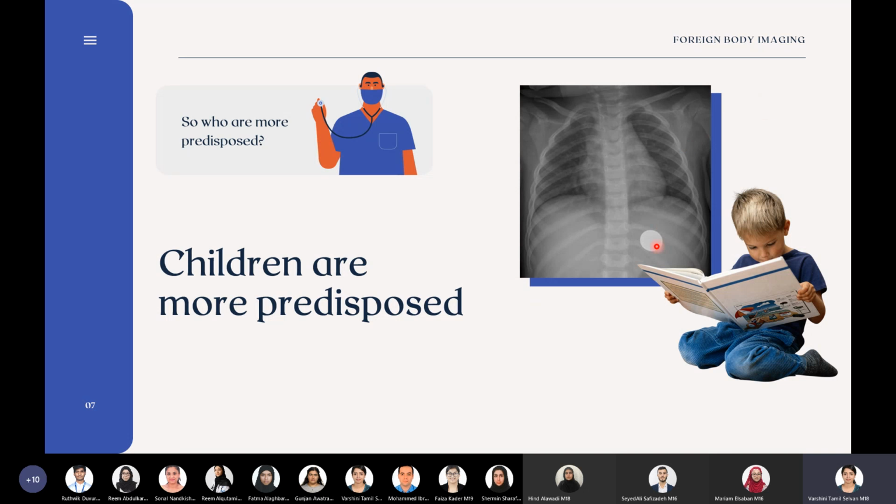So, as you can see in this x-ray here, a coin is seen in the stomach of a child. Okay? And fortunately, the vast majority of all swallowed objects, they pass through the GI system without a problem. However, we should be mindful that approximately 70% of children have been witnessed to have had a choking event at the time of aspiration of a foreign body object. Children may otherwise present with cough, dyspnea, or irritability.